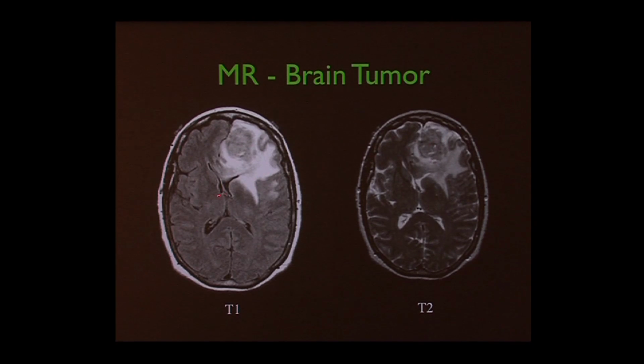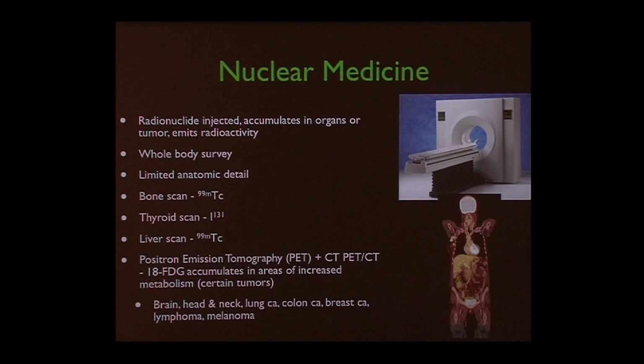This is the tumor, and this is edema fluid leaking out into the tissues of the brain, and you could see the compression of the ventricles. These are those fluid-filled ventricles we talked about in the ultrasound. Dark on a T1 on this image, and bright on this image, and you could see the mass effect of that tumor, and a lot more information can come from that.